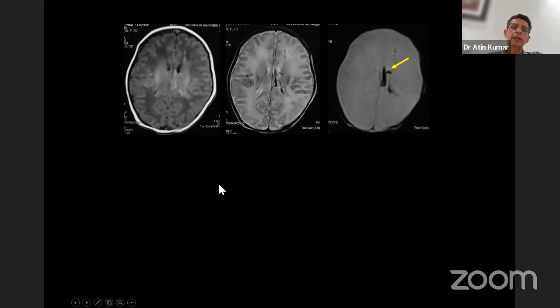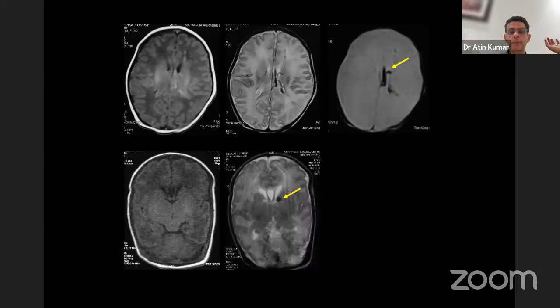So in this neonate, a 7-day-old child, MR was done on T1 and T2. On the T2, we had a doubt of this being slightly hypointense. Again, some dark area appearing here in the ventricle, but we're not too sure whether this is a bleed or not. But once we did a susceptibility weighted sequence, which I told you about, it was something which was blooming up. We were confirmed that there was a bleed in the ventricle in this patient, which was maybe a chronic bleed, which had happened maybe antenatally, we are not sure, but this was a bleed which could be picked up.